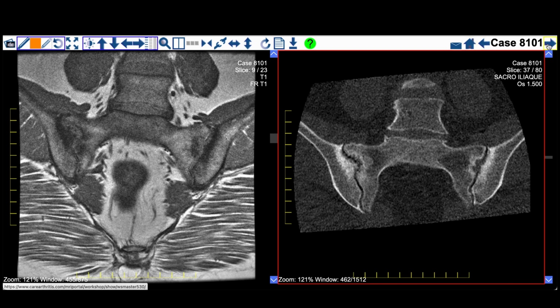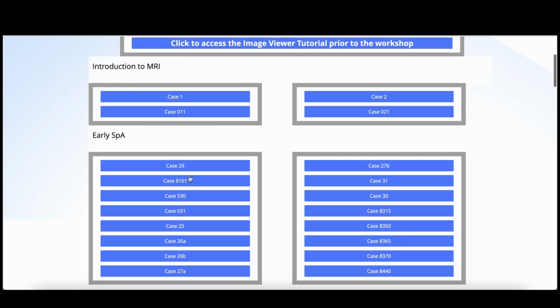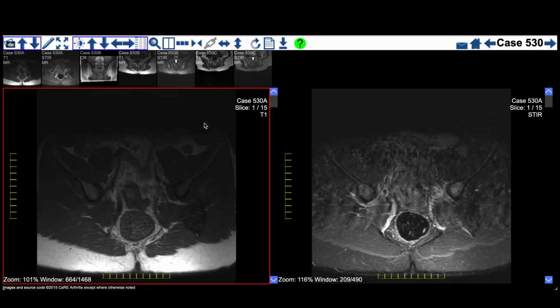Now it's also important that we understand the sequence of changes over time, because lesions change, and when you order an MRI image, the appearances will of course vary over time.